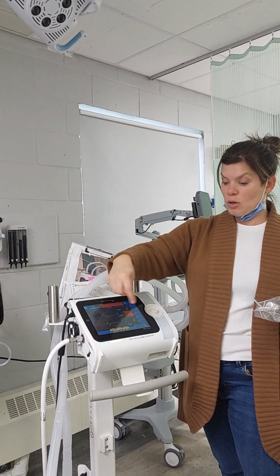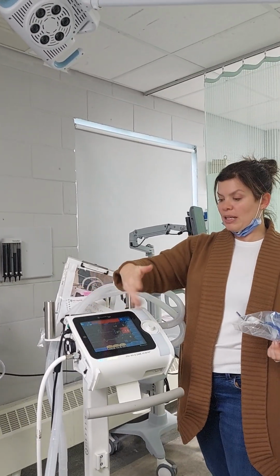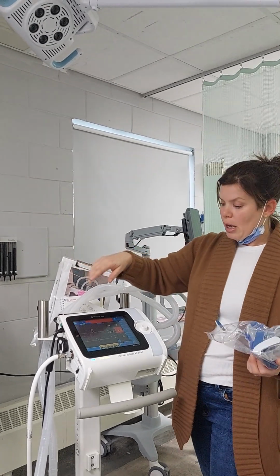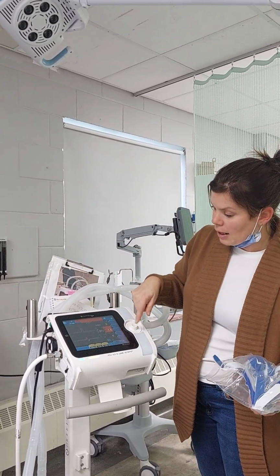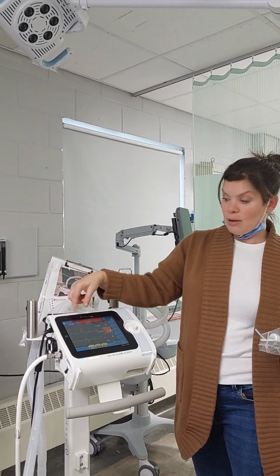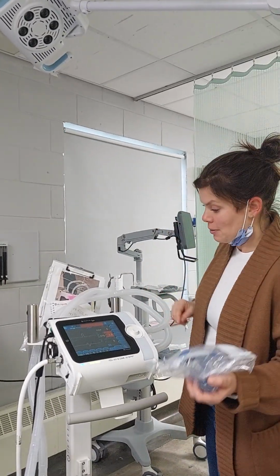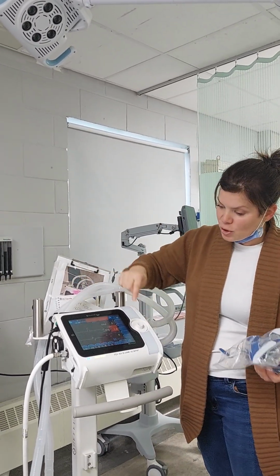It's going to keep doing that. If your patient starts breathing, I believe it just turns off. But you can come back in, and once it goes to it, it will say apnea ventilation and have an alarm. It will tell you: I'm helping you, but come over here now and do something about this. So that's where your BiPAP is.